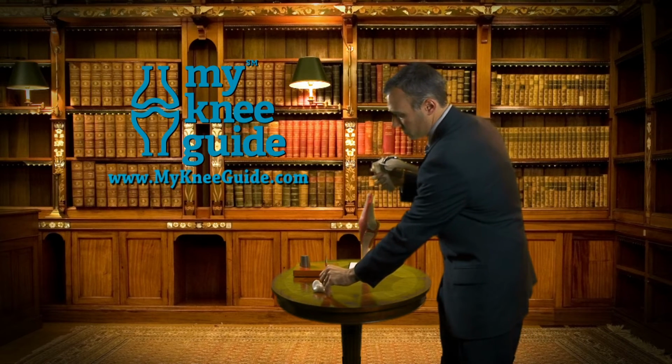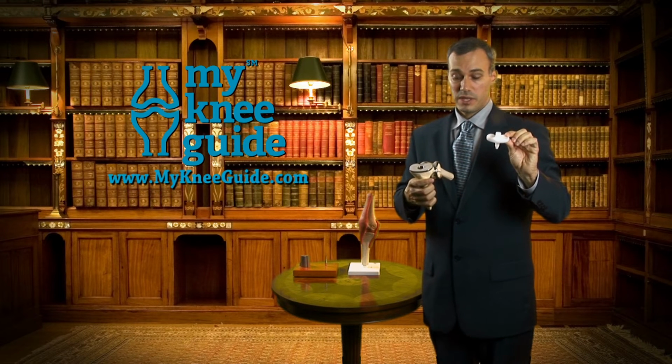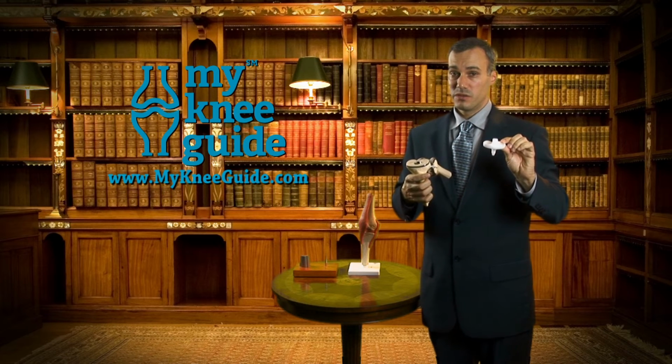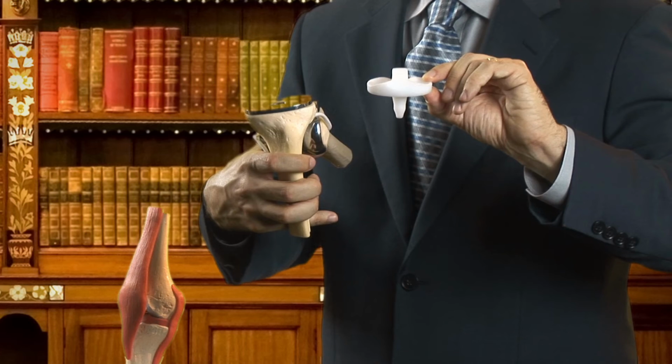Next, your surgeon will place a very special plastic called polyethylene in between the two bones. Polyethylene also comes in different sizes and thickness available to your surgeon during the procedure. This particular type of polyethylene is called a rotating platform.